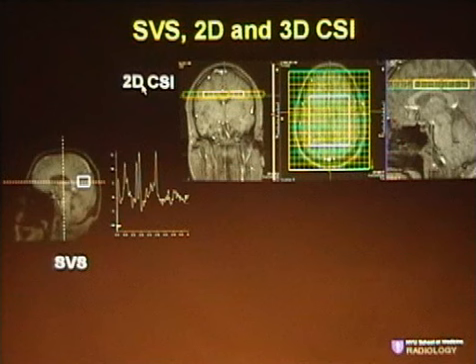So what technique do we like to use? Generally speaking, at our institution, we would use a 2D CSI multivoxel technique. So here's an 8x8 spectrum or spectral map. And we like this because you can get not only data from within a lesion, if there was a lesion here, but as well as that, some contralateral voxels as a control.